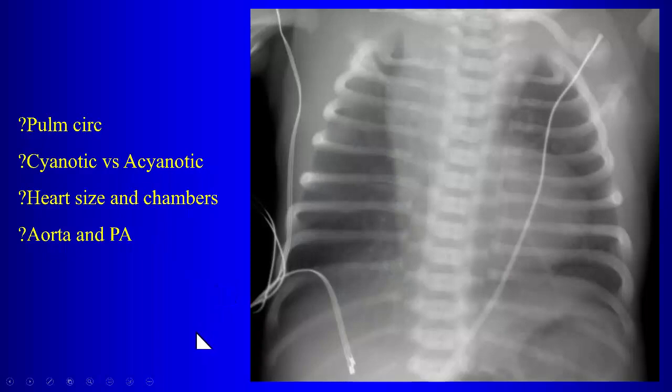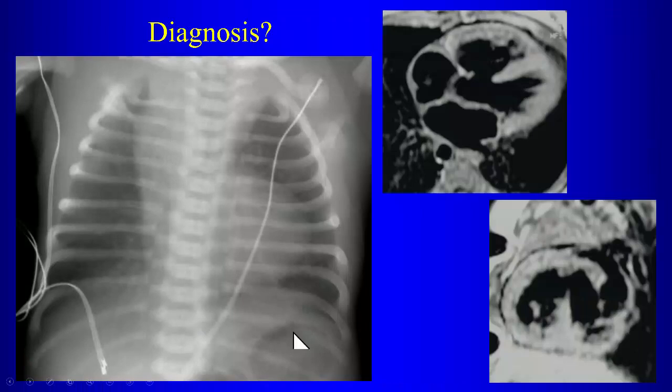Right? Okay. This patient, pulmonary circulation decreased. Patient is cyanotic. What do you favor here and why? Heart size normal or near normal, yes. So here you favor tetralogy, why? Boot-shaped heart and right-sided aortic arch. The components of tetralogy: VSD, right ventricular enlargement, right ventricular hypertrophy, outflow tract obstruction, infundibular obstruction, right? Overriding aorta. What does overriding aorta mean? Over the VSD. Yeah, so the aorta overrides the VSD, meaning it can receive blood from both ventricles, right? So that's why you get the right to left shunting.